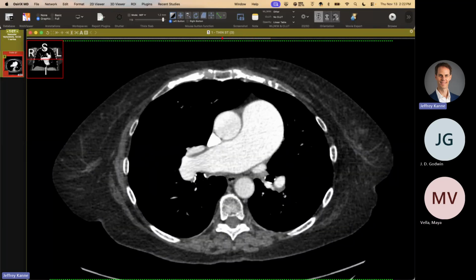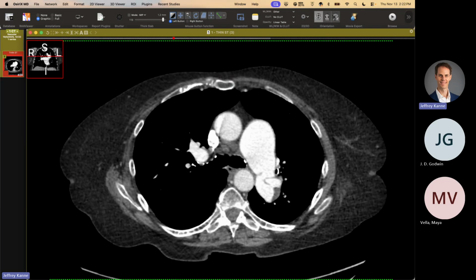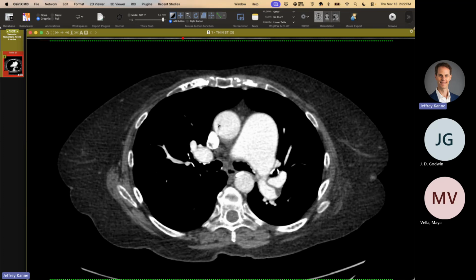Pulmonary dissections are exceedingly rare. First of all, they're lower pressure. Many of them are fatal and often associated with severe pulmonary hypertension. But I had an older study that showed this being exactly the same from many years ago. I've only seen one other one, and it was not a good outcome. Again, very, very rare, but just not to be confused with chronic PE.